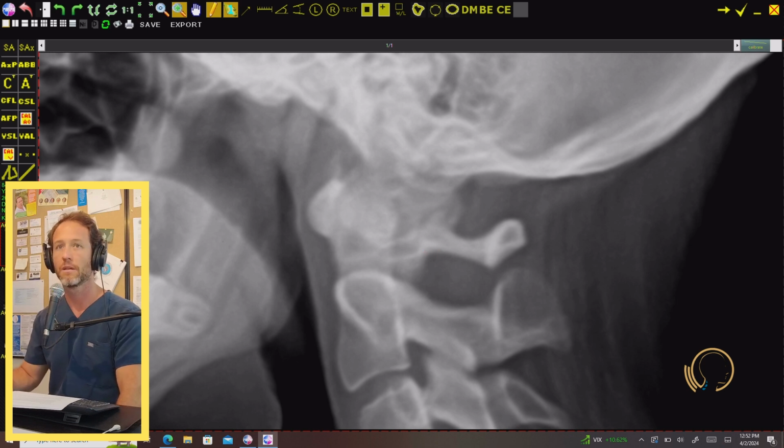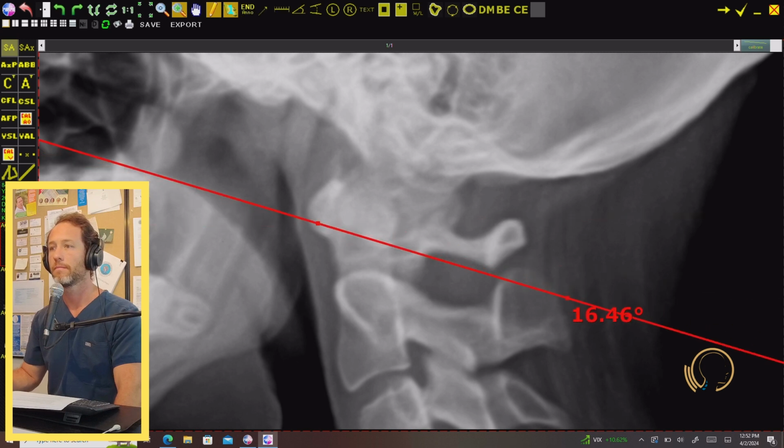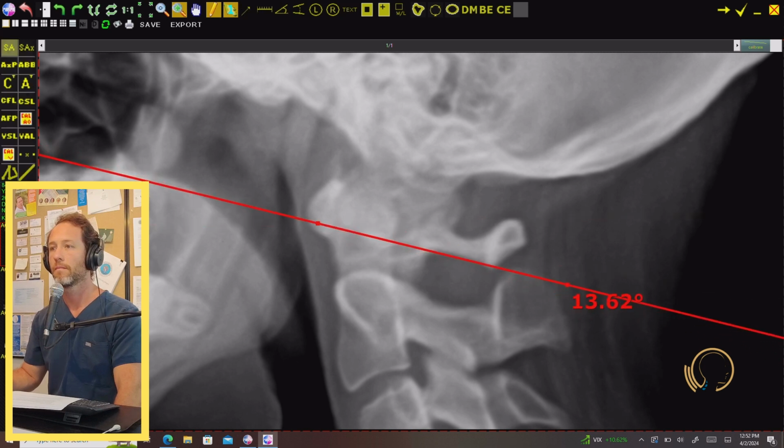So in practice, I'm going to bring my tool. All right. But the idea is you are capturing the plane of the posterior arch. You would draw a line through those 2 points, both at that intersection of the lateral mass and posterior arch, and then a quarter inch behind it. That's where you're scribing your line through. So you can do something similar by just dropping your line and capturing those 2 points.